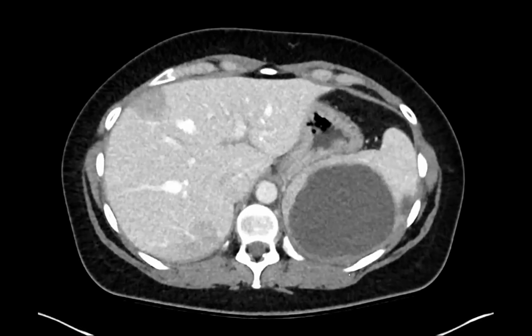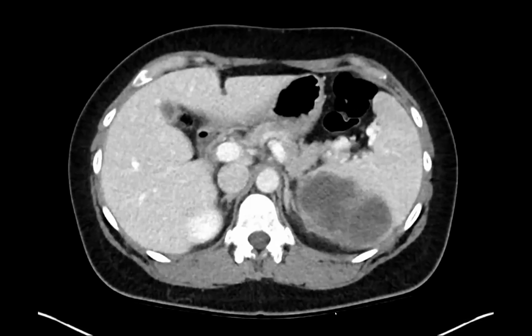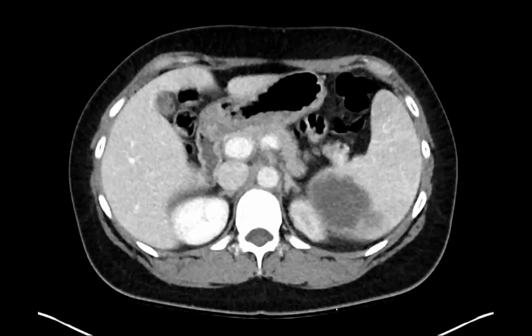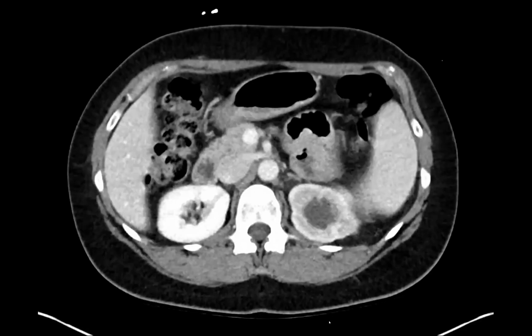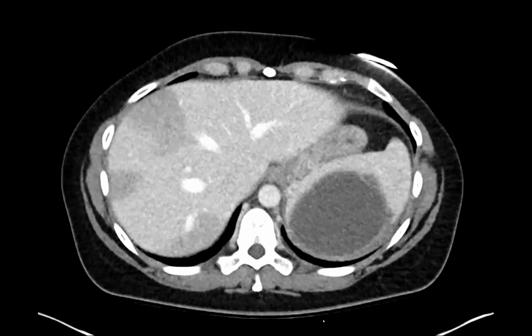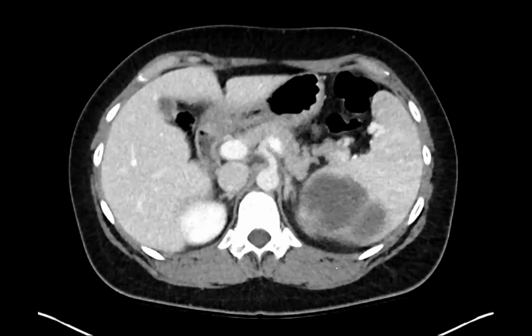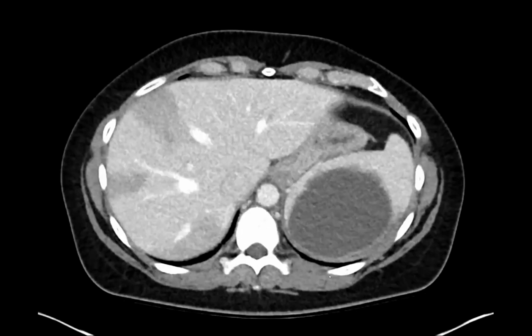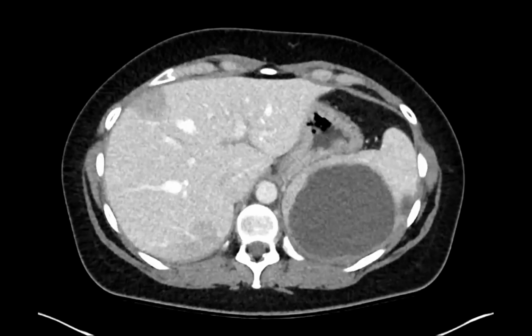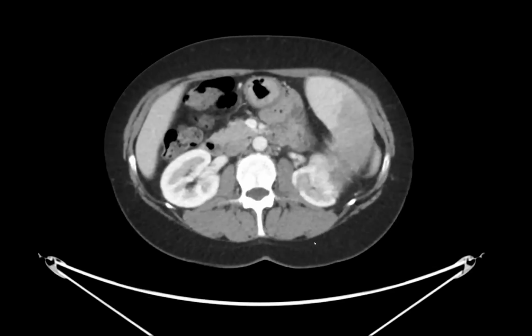Tarun, what would you say about the spleen? Would you say I think it's a met? Have you seen cervical cancer met do this? Yeah, I have not seen cervical cancer met to spleen, but it can be, I guess. Yeah, so we were really confused. I would say this is a differential case. We said, if it's, I guess it could be a met, but it could just be an abscess. Okay, so time went on and the splenic process was getting bigger.